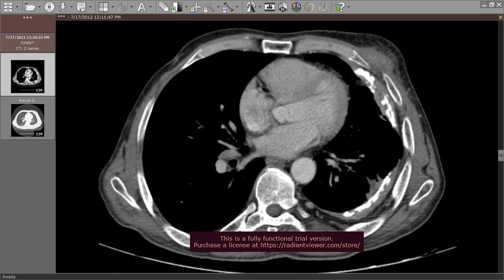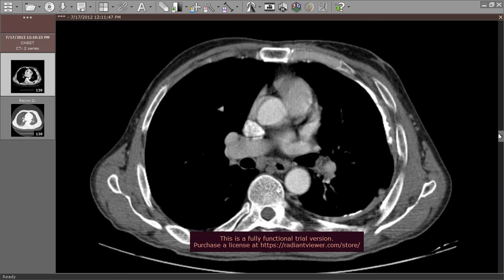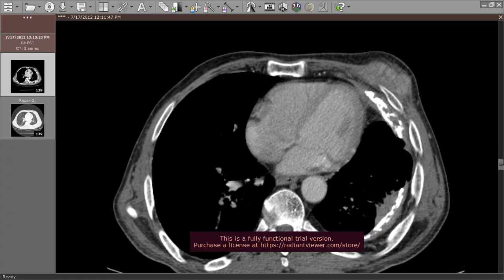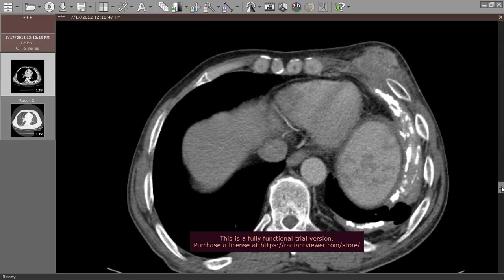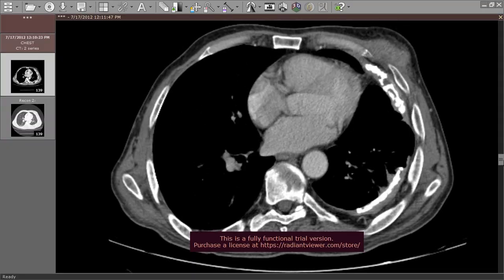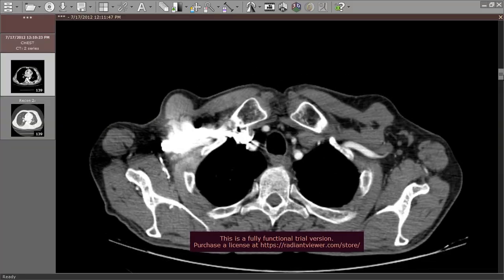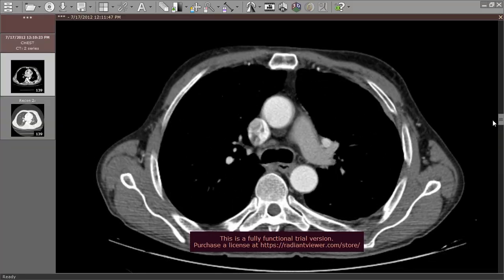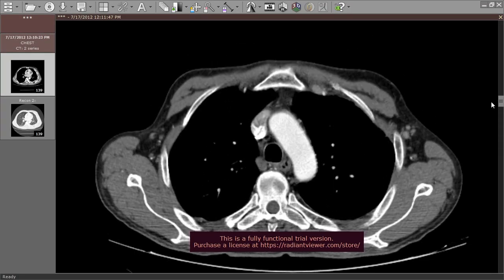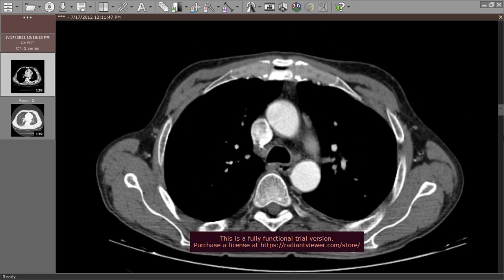The patient had a positive occupational exposure history. There is no obvious bony destruction here. The lymph nodes here are not that obvious, unlike the classic mesothelioma, not on top of asbestosis. Here we have only shoddy mediastinal lymph nodes.